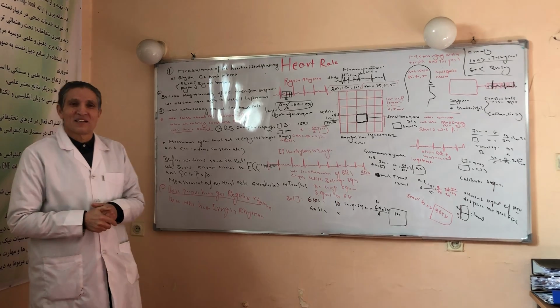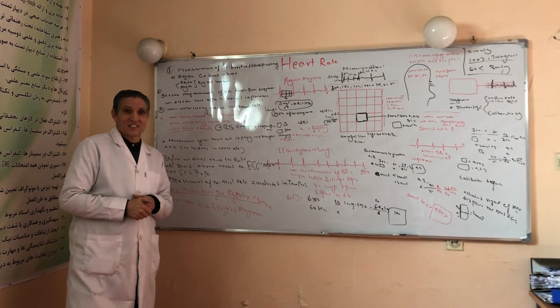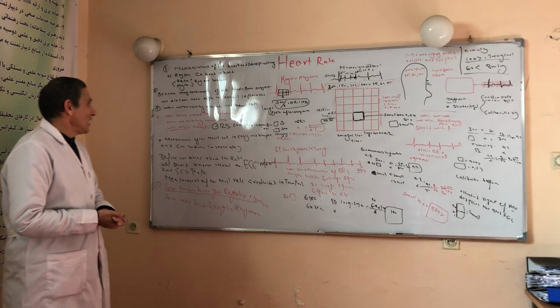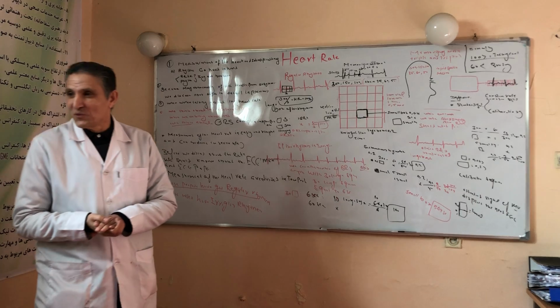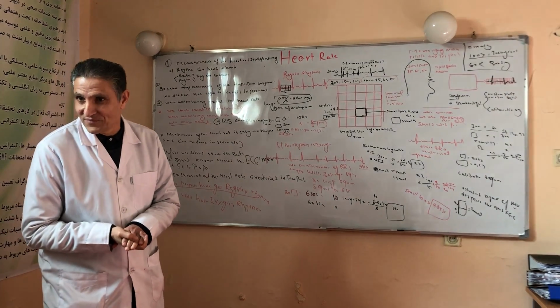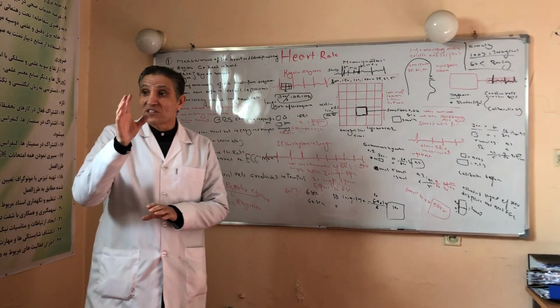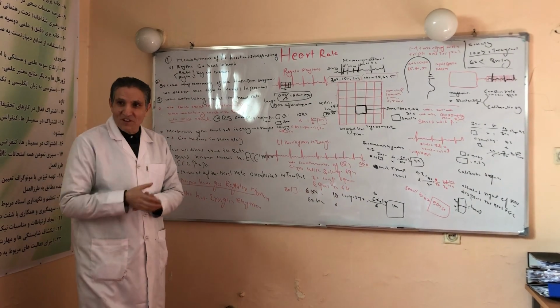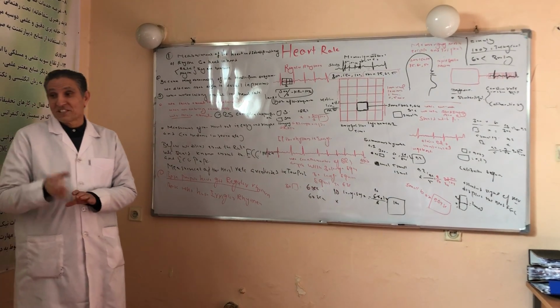We discussed arrhythmia and the normal rhythm in detail in a previous lecture, and right now we'll be discussing the heart rate. When we are talking about the heart rate, we should think about the ventricular rate, which is the number of QRS complexes produced within 60 seconds. Remember, measurement of the heart rate is very simple and easy, and we can do it in several ways.